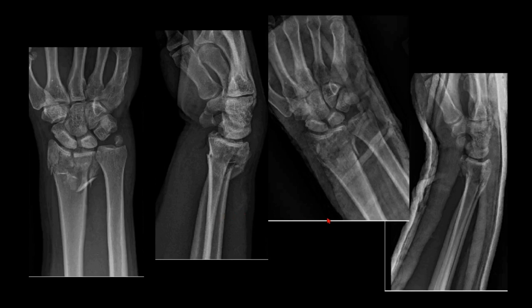In the emergency department, he was reduced. He didn't require a ton of reduction and was placed in a sugar tong splint. And you can tell he's in a splint now because he's got this nice cast material sort of silhouetting the two films taken afterwards. And you can see that there's a little bit of a volar flexion here to keep the wrist in a very neutral position. That's why this is kind of angled like this. That's intentional.